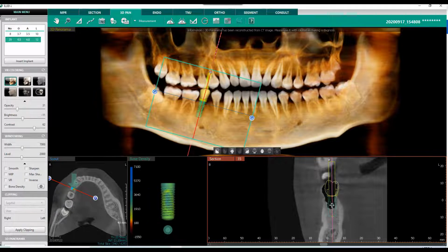I can come in and move this if necessary. Scroll more mesial back distal. Click and drag this down inferior. Click on my crown or implant, and I'm moving my crown itself. And I'm going to move this out of the way. You can see our guide and our path that are also on the image there. And that shows the implant being placed. And I can scroll through.